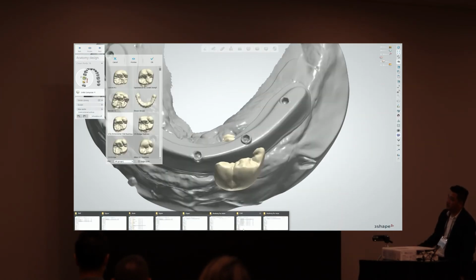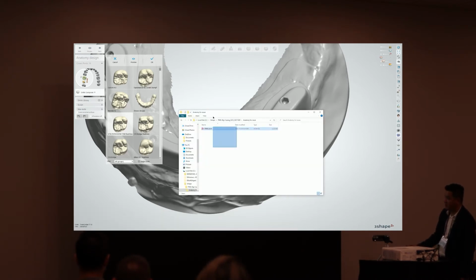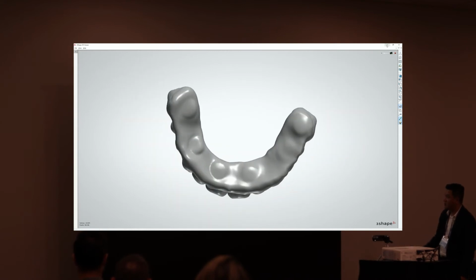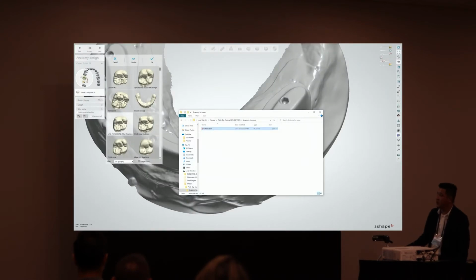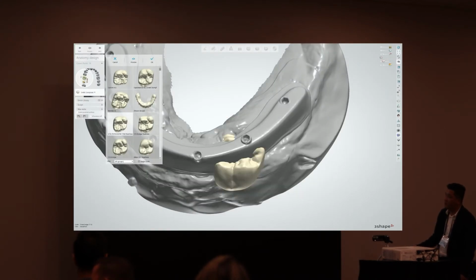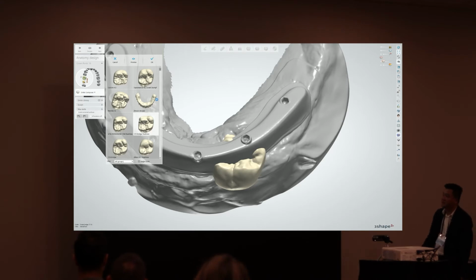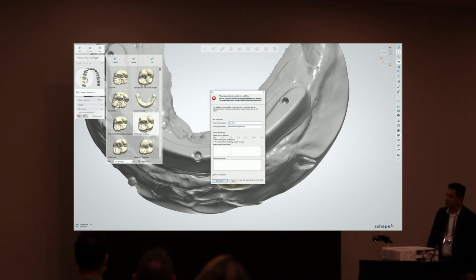So now we go here, there's my anatomy for reuse, and we're going to click on that. We just want to make sure that file's there. That's what my little design looked like. And we're going to load it in. Well, we're going to attempt to. You can see here we can click a whole bunch of different ones, but this one that says anatomy for reuse, we'll click it and, uh-oh, what happened here? No, there was an error.